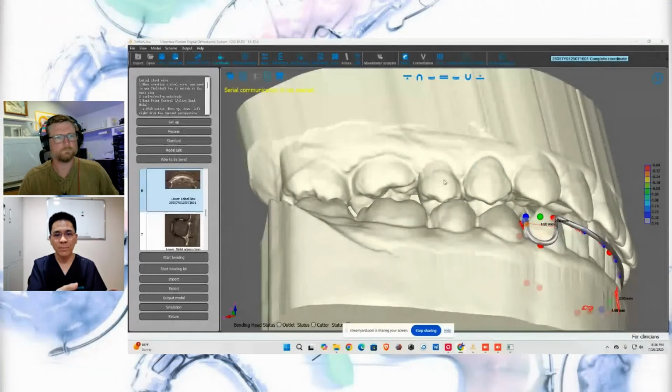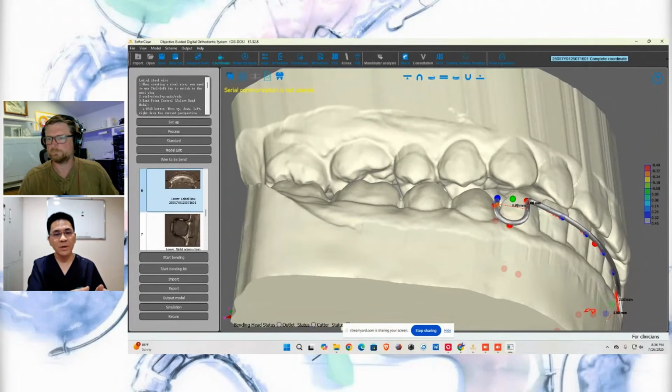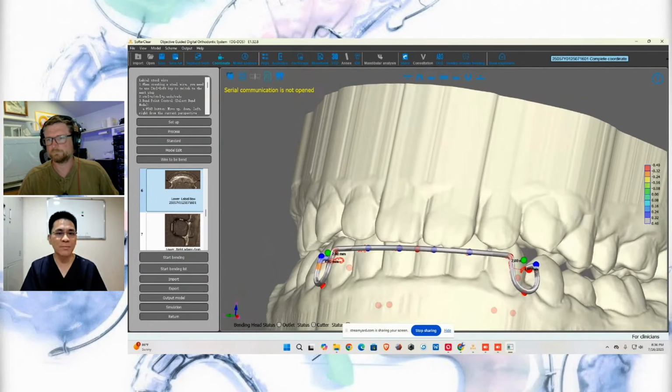So when we do the automatic bending machine, we need to make the whole procedure more efficient. So I think we need to dig the hole automatically. Then when we have finished bending the wires and put them on the model, it needs to be fixed. Before, we used wax to fix the wires on the model. So I think we need to generate the slot to put on the wires. Then you don't need to use wax. So this is the reason.